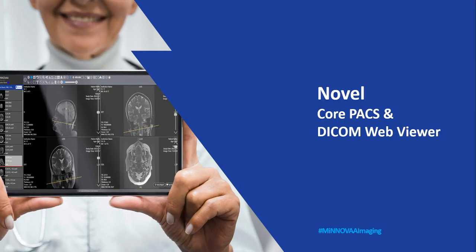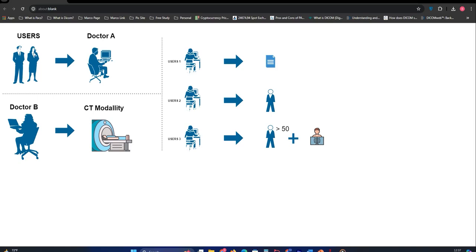The authority is responsible for managing various resources, including users, image sharing services, and servers. This feature allows for the planning and proper organization of each resource to optimize the radiology workflow. For example, we want users X and Z to only see the images of patients reported by Dr. A. Or in another example, we want Dr. B to have access only to the images of patients whose modality is CT scan.